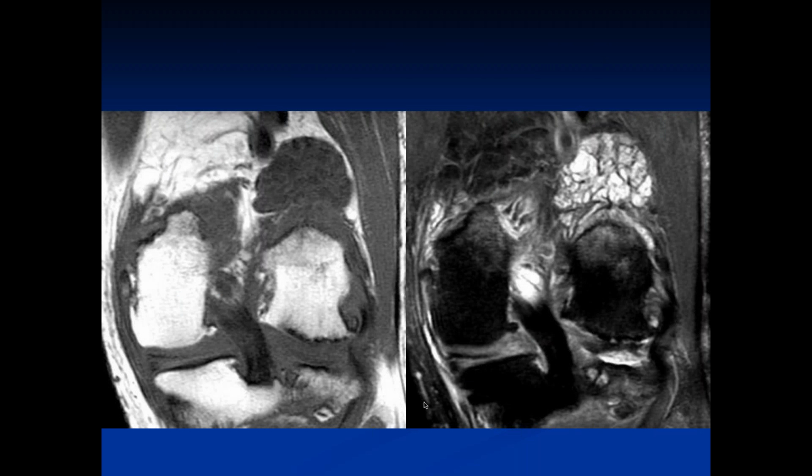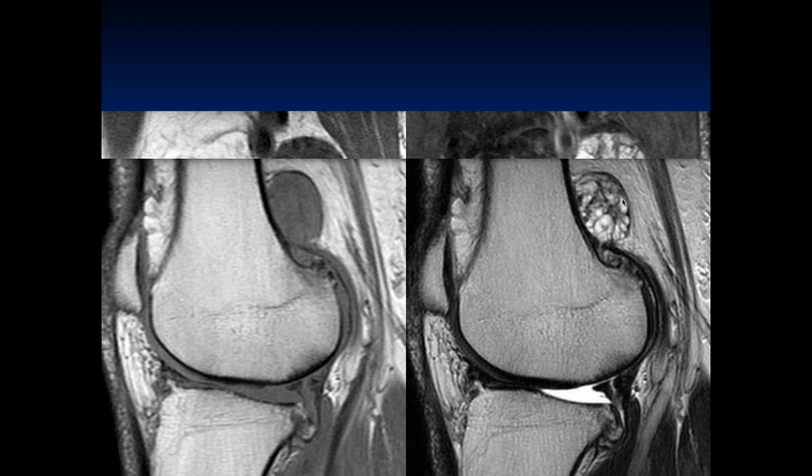Okay. Jeff, what do you think of this case? I have coronal T1 images through the posterior knee, also a STIR image in that area, and we have a large septated lesion demonstrating hypointensity on the T1 images and hyperintense signal on the STIR images. So we have sagittal T1 and then maybe T2 images in the same area, and this is a rounded lesion, again demonstrating T1 hypointensity and septations, T2 hyperintensity.